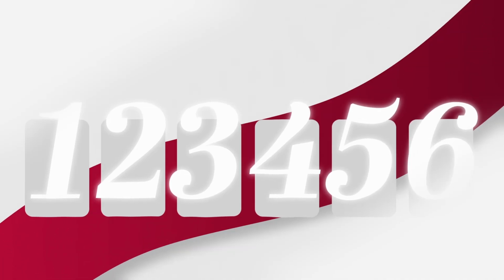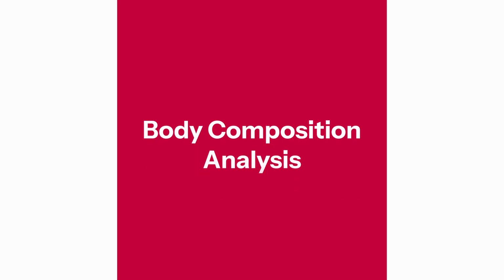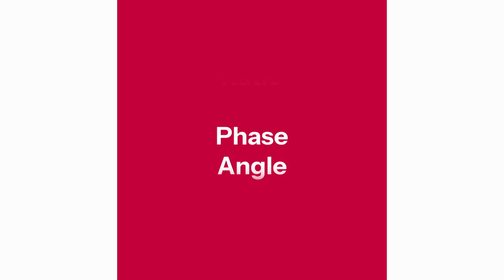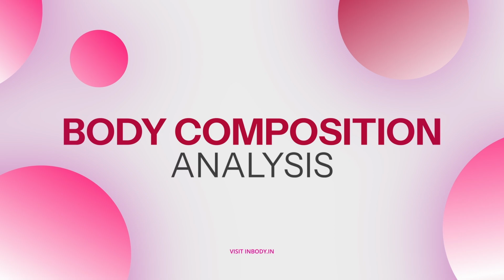The InBody 380 result sheet is divided mainly into 6 parts. So, we talk about body composition analysis, muscle fat analysis, obesity analysis, then again the ECW ratio, phase angle, body composition history. Let's talk about the first part, body composition analysis.